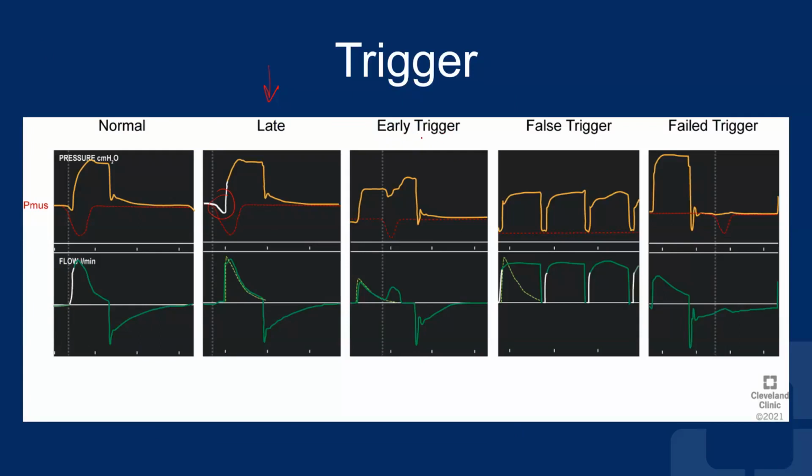The next one is false trigger from fluid in the circuit. I showed you an example of condensation on the circuit, and this is as smooth as it gets. So this is out. But your eyes go down and you see the most beautiful square root sign, in which this is the amount of tidal volume that got inhaled from here to here. And this is the amount that got exhaled, and then the ventilator resets, and again it starts the cycle.